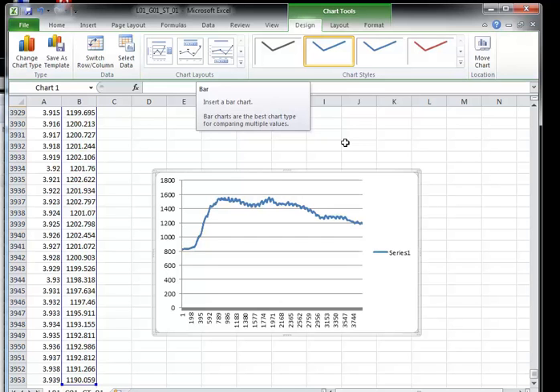There's a few things we can do. We can look at what's happened when they've been collecting the data, and also is it reasonable? Well, as you can see, it starts off at over 800 newtons, which suggests that they zeroed the force plate when the person was stood off the force plate, and then they've stepped onto the force plate, which is fine, but we just need to make sure we're aware of that so we don't consider their muscular force to be too much, because obviously their peak is up to, say, 1550 newtons approximately, but that's including their body weight.